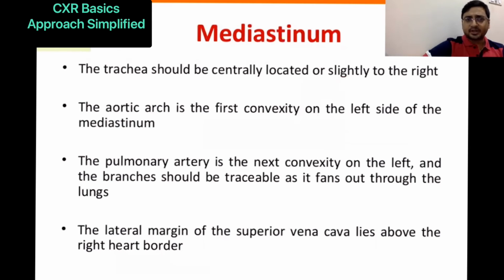Coming to the mediastinum, the trachea should be centrally located, as I have told initially, and it may be deviated in cases of some mediastinal pathology. It may be pushed to the right, it may be pushed to the left.